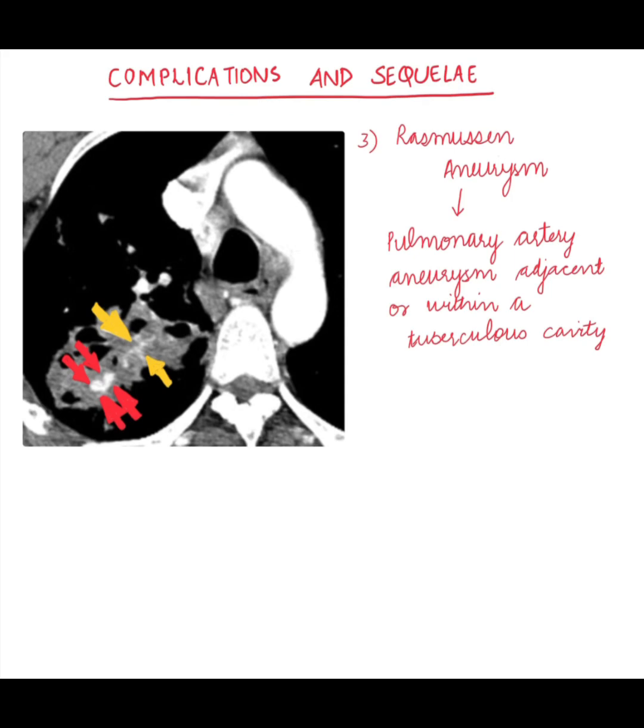As you can see in the image, this hole is the area of cavitation, and you can see this in the red color.